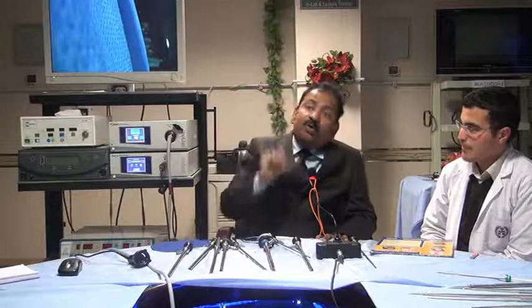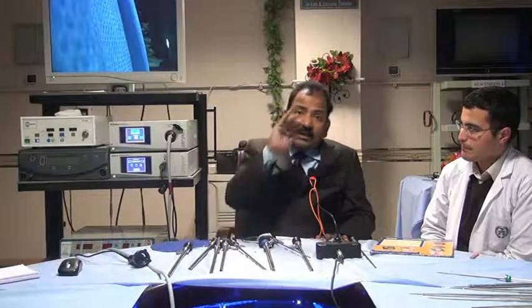Shadow is helpful. Why is it helpful? Shadow gives you texture gradient. Darker means deeper. Brighter means elevated. If the tip of the nose is bright, that means it is elevated. The grooves of the nose are dark, that means it is deeper. Shadow gives you the contour, grooves, and then you know the curvature. But only if the shadow falls properly.